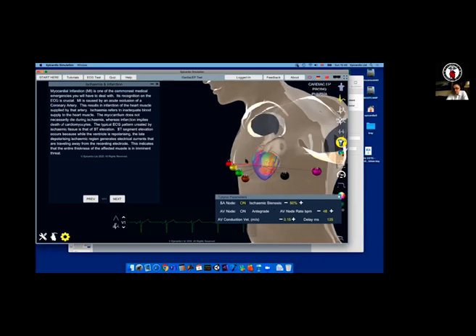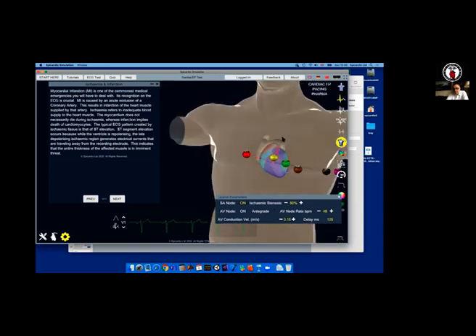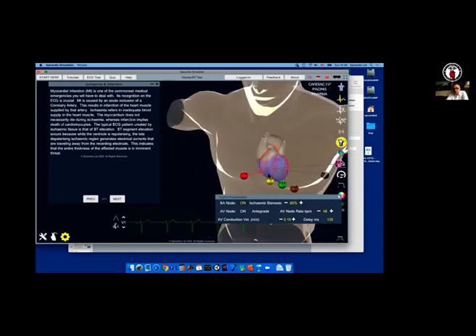And this picture here, the 3D picture with the leads and the position of the ischemic region, can help us understand where to expect which leads should show the ST elevation more pronounced.